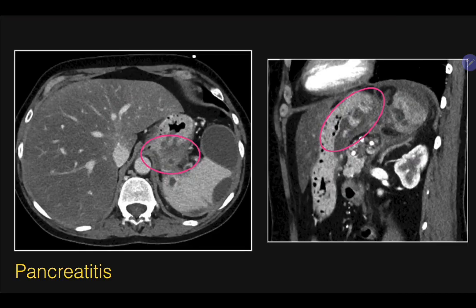In this case of subacute pancreatitis, pseudocysts are dissecting into the wall of the stomach, compressing it and causing inflammation. There are also pseudocysts burrowing under the splenic capsule and compressing the splenic parenchyma.